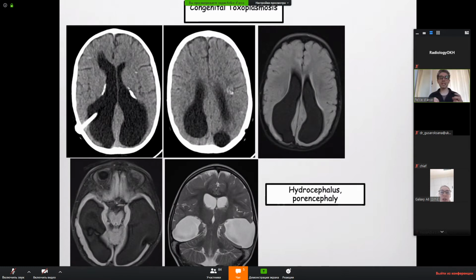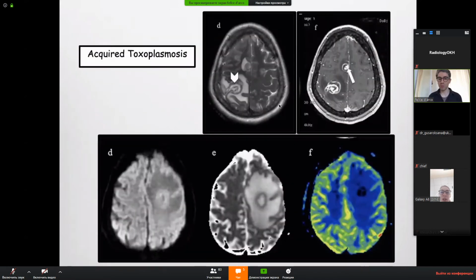But it's important to consider that in this case there is hydrocephalus, so the system is under pressure, but there is also a combination with loss of white matter. So you can have a combination of ex vacuo dilatation of the ventricles with an obstructive one, and this typically happens in congenital toxoplasmosis, with enlargement of the ventricles, particularly the posterior temporal aspect of the ventricle, okay?